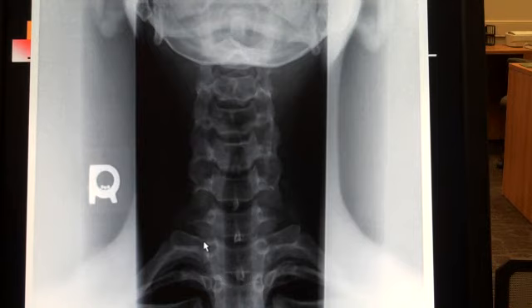The transverse process of T1 goes all the way out to here. And you also then have this first rib coming in and articulating with this rib, and then it goes on in to articulate with the vertebral body. So that first rib is all of this and goes in this direction. Now the second rib, of course, would be this coming across right here, and down here is the third rib coming across right here.